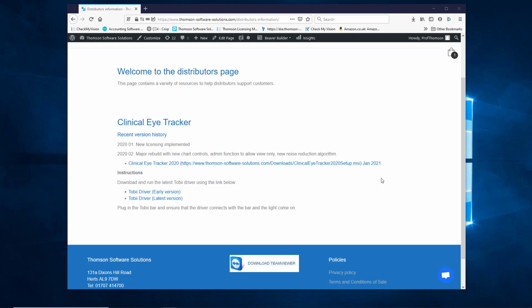So in this video I'm going to show you how to install and do the initial setup of the clinical eye tracker. You can download the software that you need from the distributors page. The first thing you should really do is download the Tobii driver.